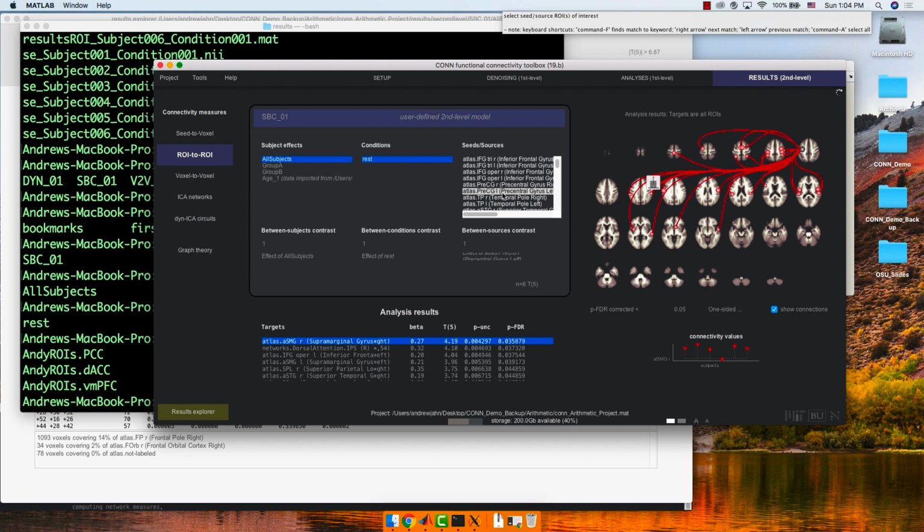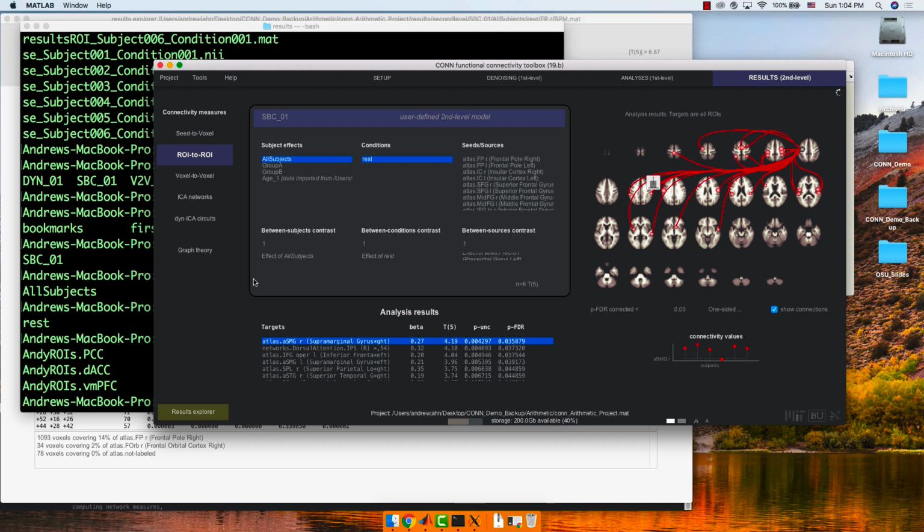Okay, we're good. I don't have that atlas in this particular case, but it's okay. We'll import it.